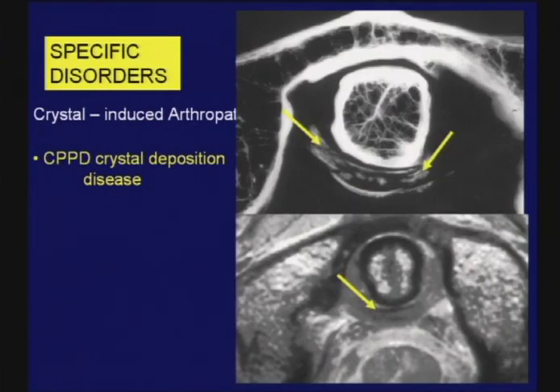And we can even look up in the neck and see this manifestation of calcium pyrophosphate. I'm sure you've all seen this on CT exams all the time. This is the transverse ligament of the atlas that extends around the odontoid process. The patterns of deposition here can include mass-like areas that impinge on the spinal cord that look like tumors.